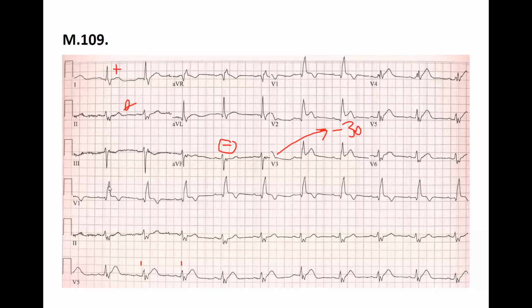And then let's see the P wave, PR interval. We do see P waves, and maybe you don't see them because lead number 2 is very noisy, but you do see them in V1. If you want to find a P wave and do not see it nicely in the limb leads because something happened, go for the chest leads.